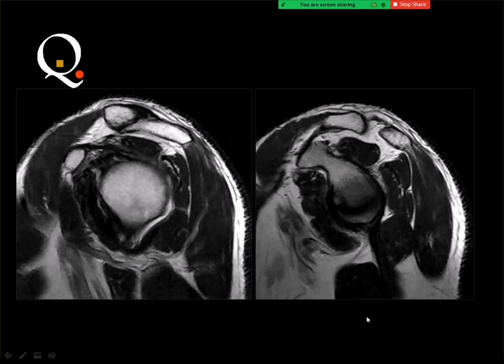Previously, I used to say that the frozen shoulder is diagnosed by thickening and tightening of the inferior glenohumeral ligament, and also you get thickening and tightening of the capsule at the rotator interval. And you know that the rotator interval is the space between the supraspinatus and the subscapularis. In this space runs the coracohumeral ligament, this ligament. And there is some fat around the ligament.